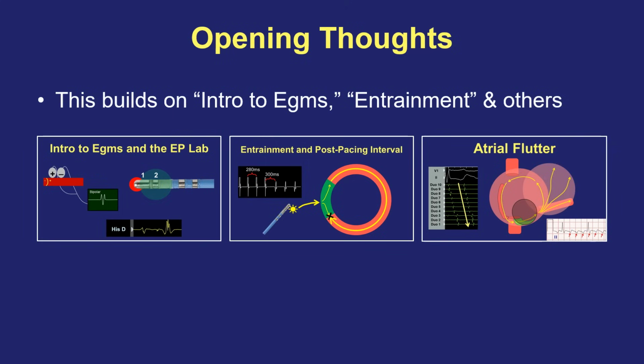There will be a lot of overlap because I will review how to interpret electrograms and where catheters are placed, but if you find yourself not understanding a particular basic concept that I don't explain in enough detail here, you might find your answers in one of these other videos, and then you can come back to this SVT video to continue with that additional knowledge.